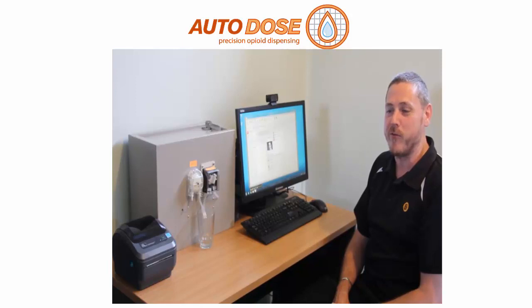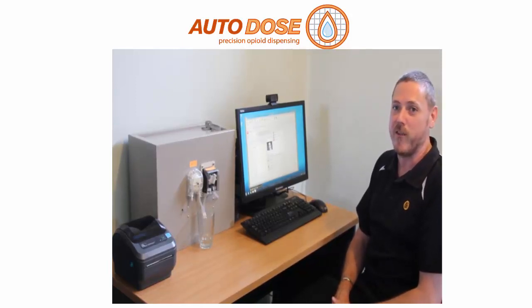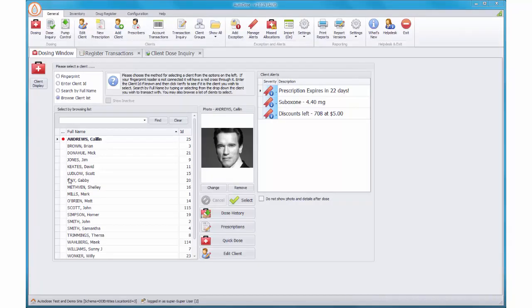We're going to run through some basics today on dosing some patients, checking out the drug register records, and looking at things like additional takeaways for those patients. Once we log into Autodose, it presents you with our patient list screen.